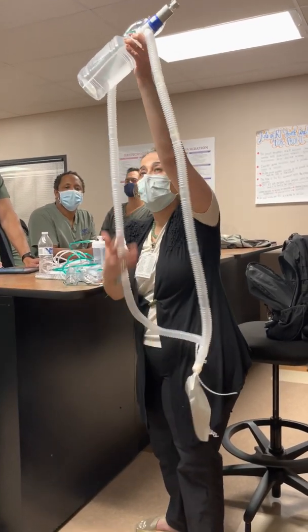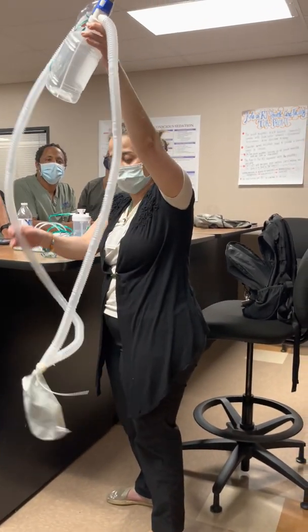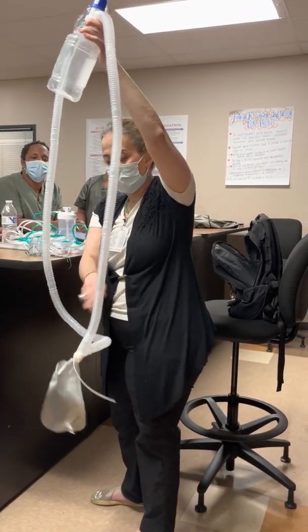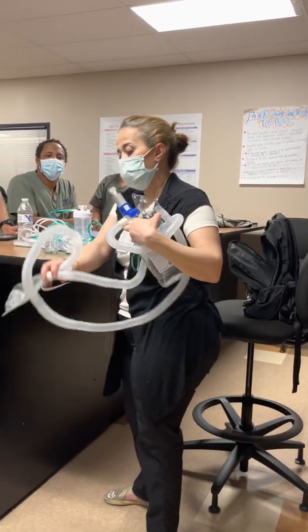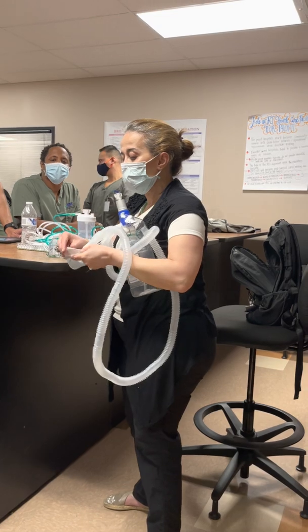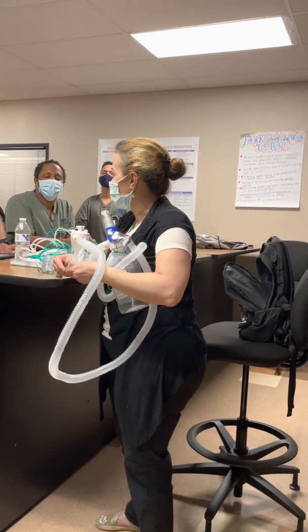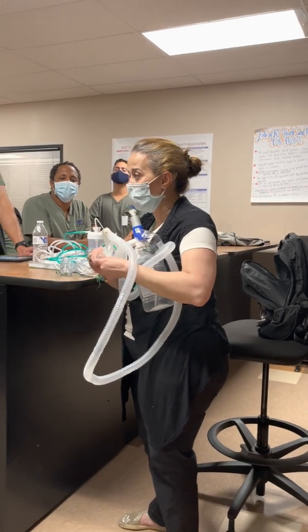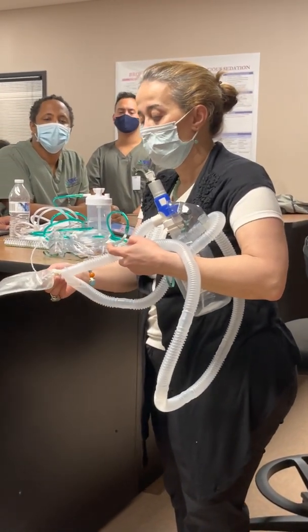So then, what is the purpose of this? It's because the water is gonna build up in your tube. When you go in the room, you can hear shh, shh, the water goes back and forth in the tubing. So you drain it in this bag. You can open this and push the water in a glove or something and get rid of it and just put it back. So this is to collect the water that's built up in here.